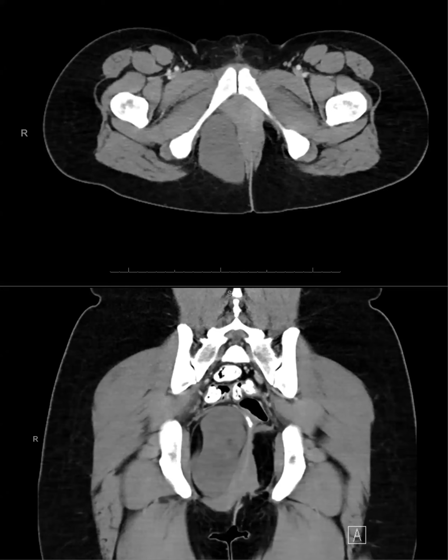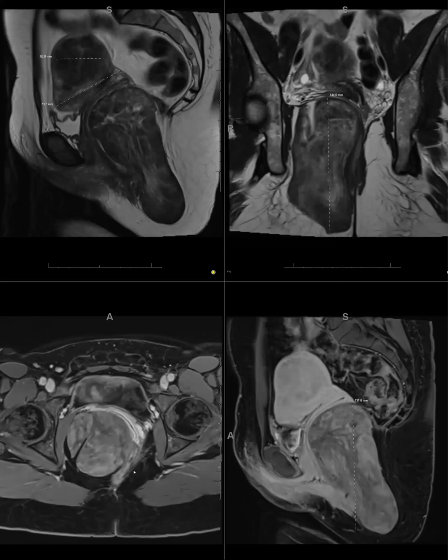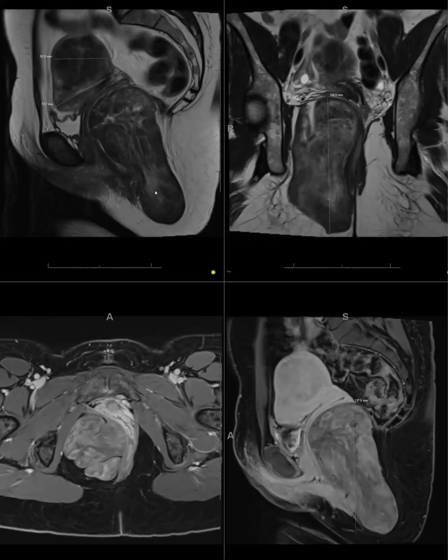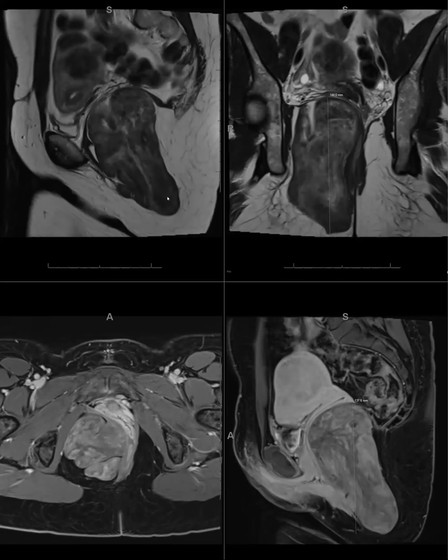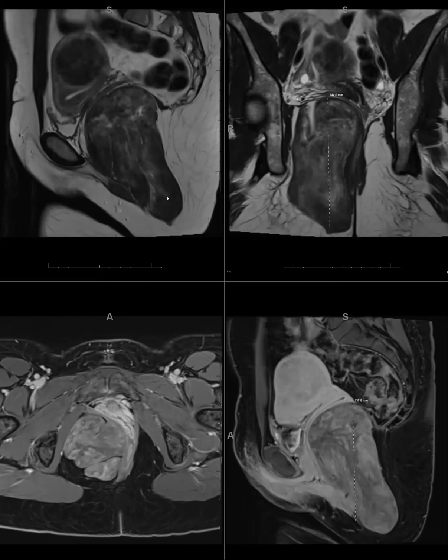Let me show you the MRI. So, about a 14 centimeter mass here with this whorled sort of appearance, even before contrast. So, any other thoughts at all? It's interesting because aggressive angiomyxoma is usually much more T2 bright. And this one almost looks similar to that fibroid. Mm-hmm. Is it connected to this at all? I wonder if it's like exactly. You're onto something.